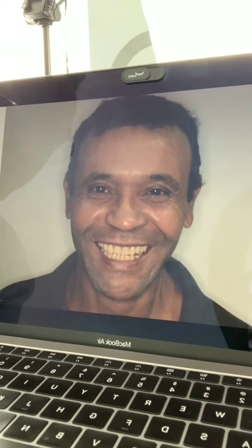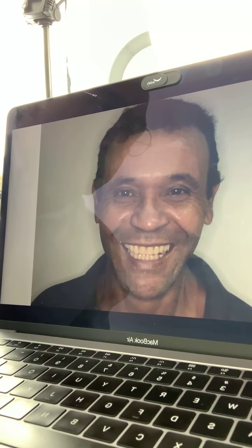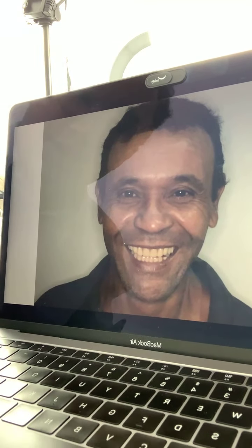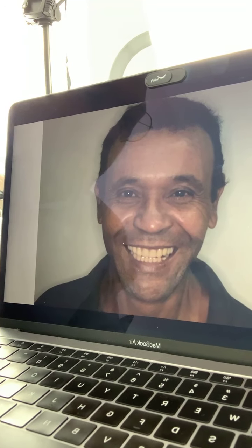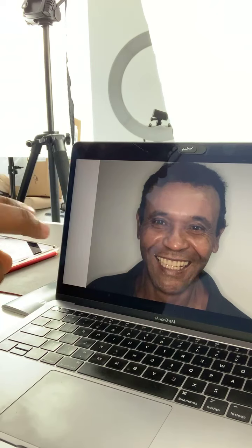And I spoke to him and told him that we use digital technology. We do our facial analysis in order to deliver a more natural looking final denture. And then he got very interested in it. We then took this picture, and as you guys can see, it's a simple frontal facial picture looking straight at the camera, with a white background and nice lighting, to deliver a smile simulation.